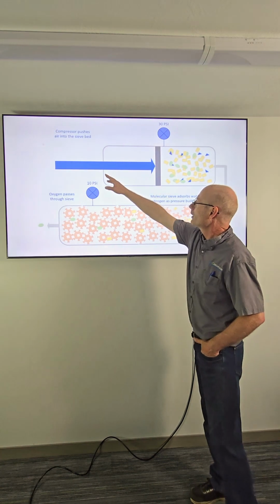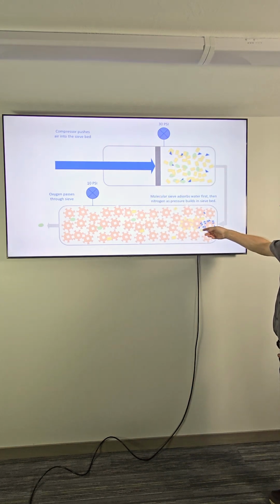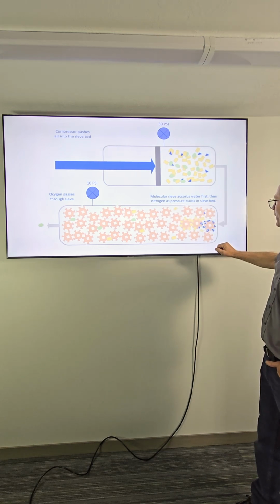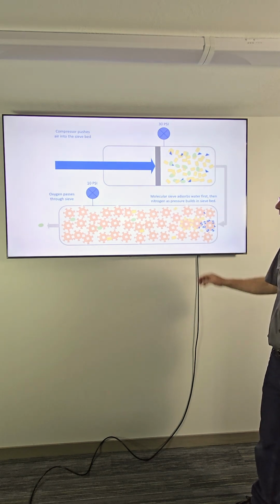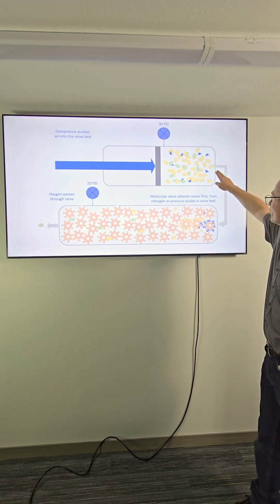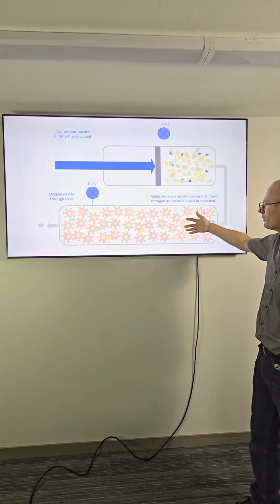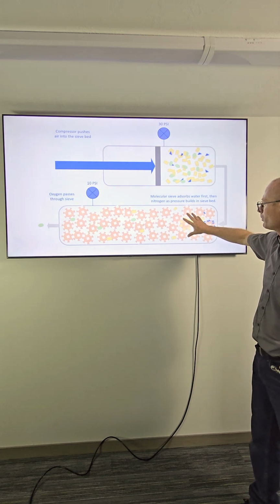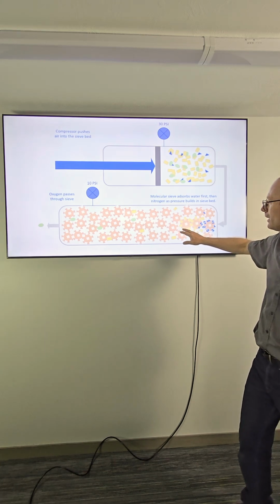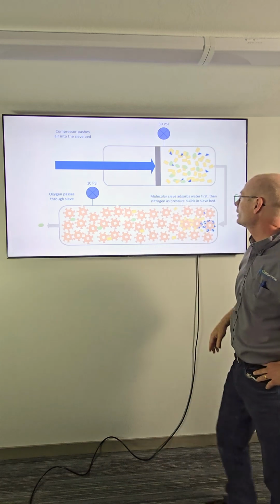So now we turn our compressor on and it begins to push this air into the sieve bed. And as that air gets pushed into the sieve bed, the first thing that gets stuck are these water vapor molecules, and they collect right there at the entrance where this air is being pushed in. The nitrogen moves on a little bit further, and as it builds pressure, they begin to lock into this sieve material. The oxygen molecules continue all the way through and come out the other end.